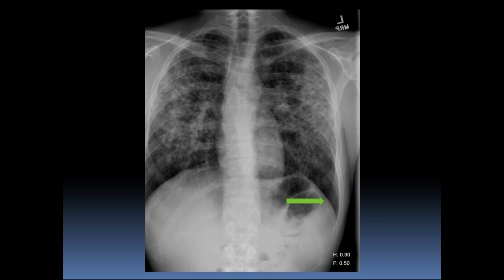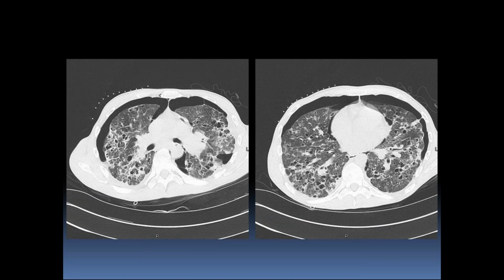So in this patient, the following CT of what I had is, unfortunately, the gentleman suffered from bilateral pneumothorax. That's obvious. But you have irregular cystic disease, and there is a differential to cystic disease. And it's irregular because it's not thin, lacy stuff. It's very ugly, really, as far as its description.